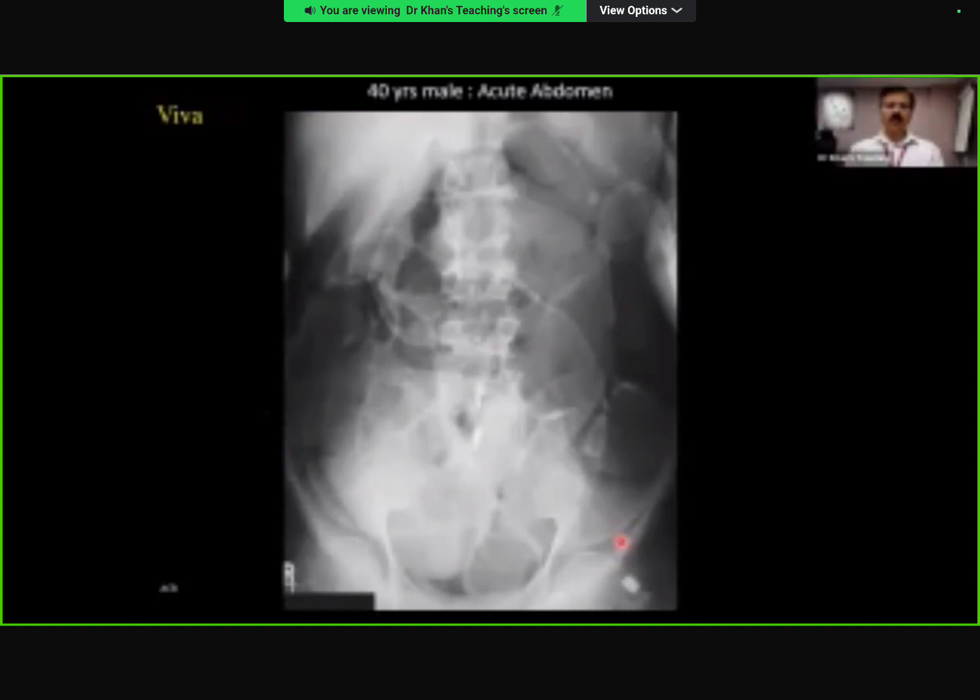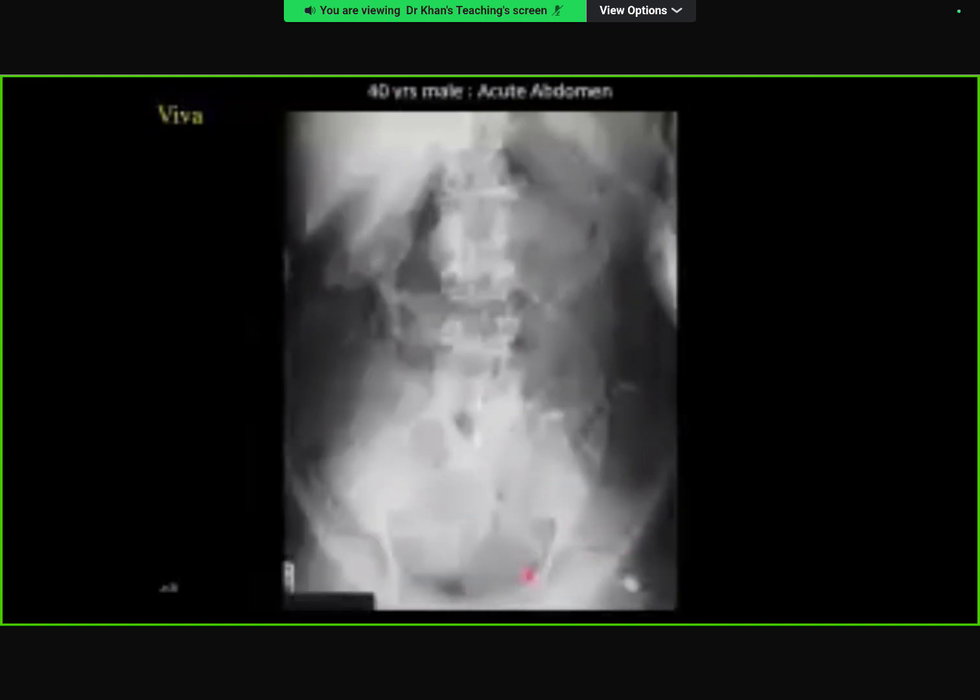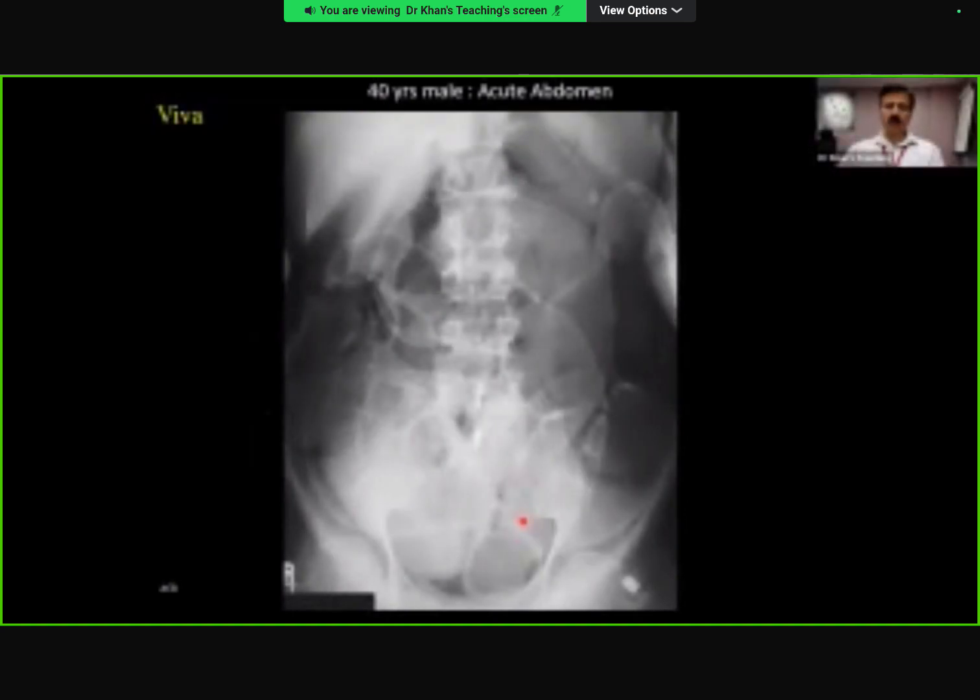Okay. So anywhere else, do you see any signs of what we call pneumoperitoneum? Your diagnosis is correct. Okay, other than the Rigler sign, within the hepatorenal angle, Morrison's pouch, there is a triangular cap sign. Excellent. Okay, well done. You can mute yourself. I'll take over, and candidate 6 should be ready after this film.